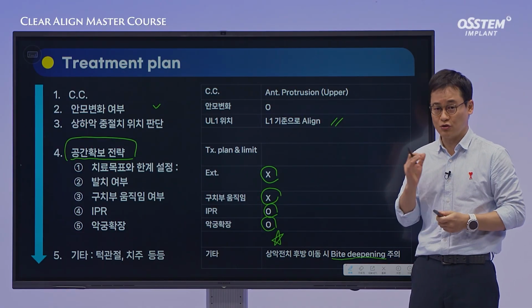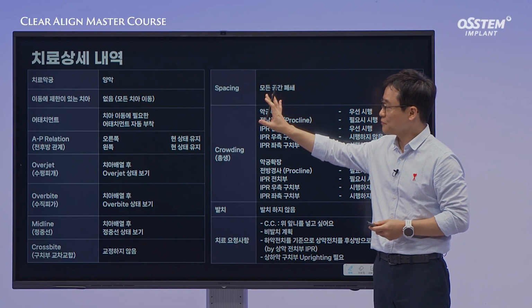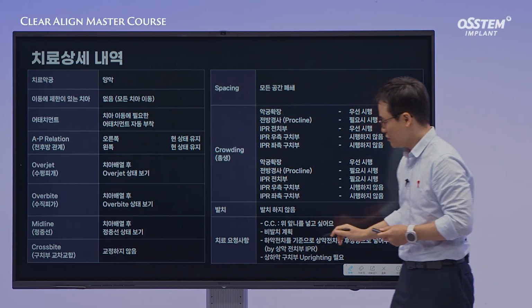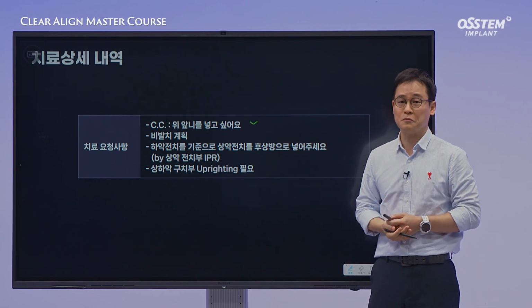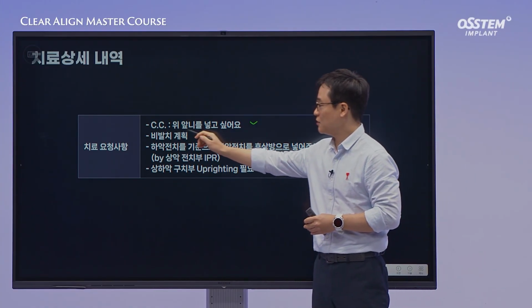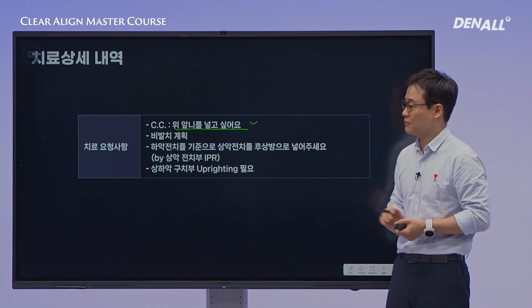Within the treatment planning system, you click on Magic Aligner and then add your comments regarding the treatment requests. You must record the chief complaint. This is essential because there is no designated section for CC. When the designer prepares the setup, they still need at least a basic understanding of what the patient wants. Therefore, the CC must always be included. And here's how I wrote it.